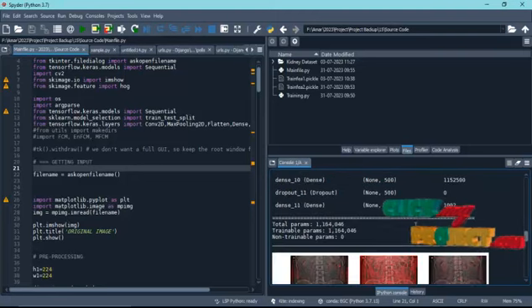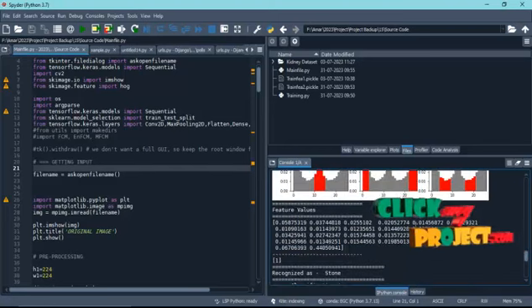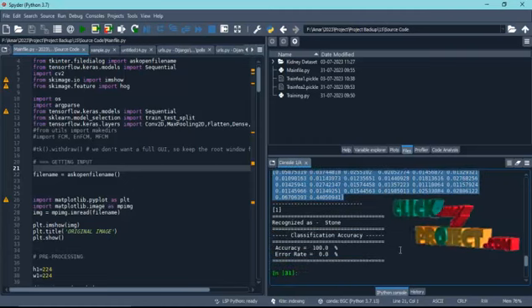After extracting the initial features, the pattern feature is extracted by means of the local binary pattern. This image represents the local binary pattern. After doing the feature extraction, those feature values are shown here. We have extracted the test feature from the input image. Likewise, we have train features for all the dataset images.